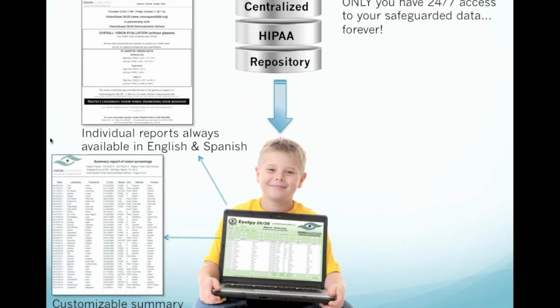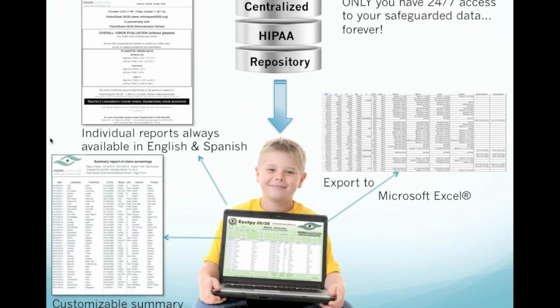What is a list of the children that passed or didn't pass, sort it by grade or what have you. And again, these are available for life, so you can track an individual child throughout their developmental years as well. Of course, you can at any point in time dump all of the data into Microsoft Excel and manipulate and analyze the data however you need to.